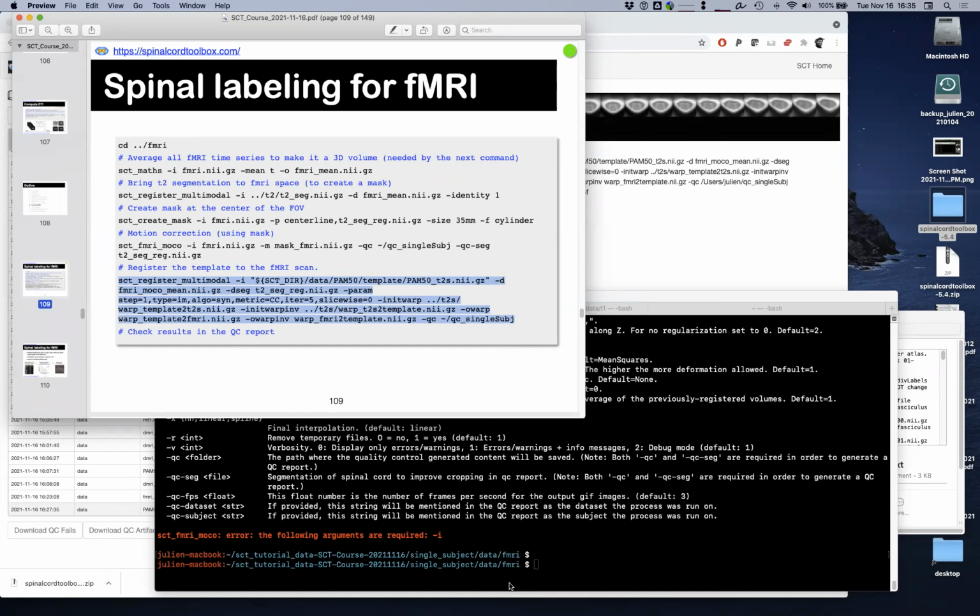Right. So for this course, I didn't want to enter into manual correction and things, but I would strongly recommend for fMRI studies to indeed rely on the spinal cord segmentation for the registration. Absolutely. In fact, that's something I should mention in the course. Could you, Sandrine, please add also a note on that? Yeah, thank you.